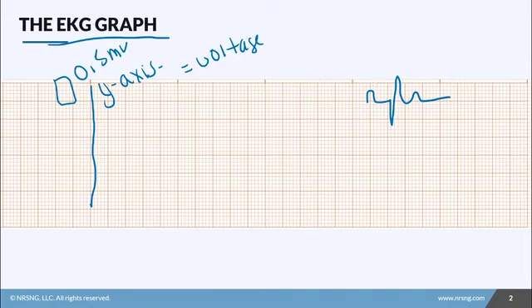And this is important when we have a STEMI, like an ST elevated MI. This right here would be elevated. Measuring the amplitude and how high it gets helps determine the severity, or if it really is a STEMI or not. Most importantly for us nurses, what we have to understand is the x-axis. This is the horizontal line, and it measures time in seconds.